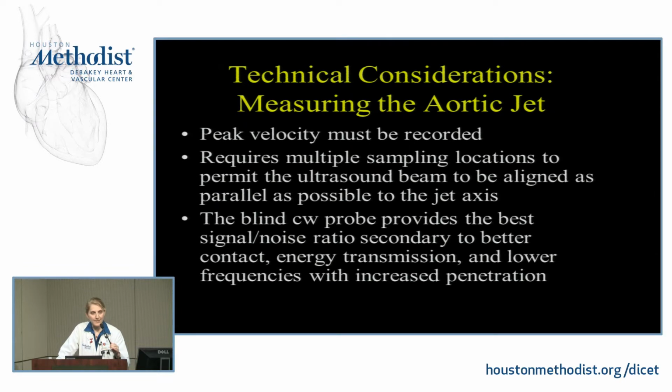And frequently it's not just with the guided CW images. Frequently it's with that blind CW probe, because that blind CW probe has excellent maneuverability and it allows you to move it so that you can get better aligned with that stenotic jet. Because if you're not parallel with that jet, you're not going to get the peak velocity and you're going to underestimate the severity of the aortic stenosis.